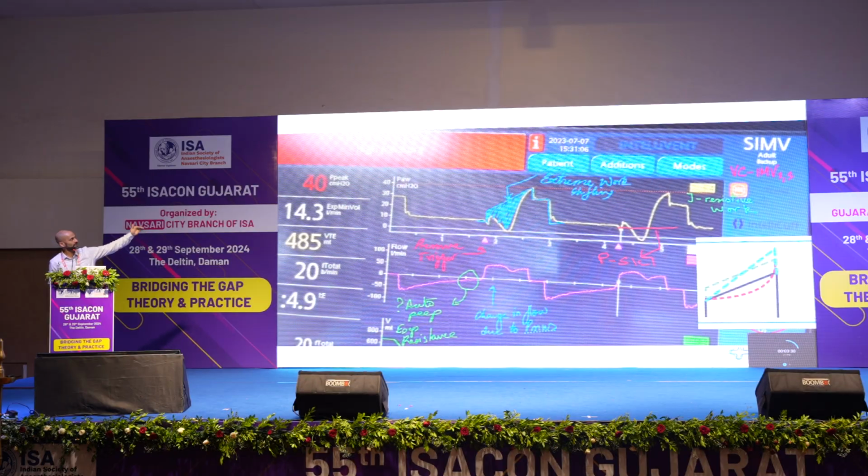And you also see all that extreme work shifting. The waveform should have looked like the blue one. Remember the pattern. And we're immediately seeing that there is a lot of patient effort here. So here you need to see, is there acidosis, is there severe sepsis, anything increasing the demand that is required for ventilation. And you can see all these features on a single snapshot. And this comes with practice.